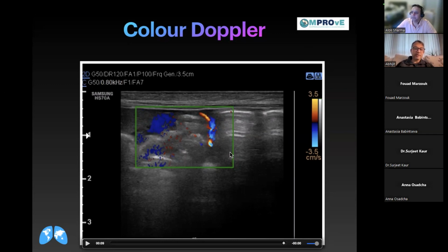The sound waves are reflecting back already from the pleural line. So in a normal lung, with the A pattern, with the A lines, you don't see the blood vessels. If your ultrasonic waves are traversing the area, which means there is no air and it's filled up with fluid, and there's an increase in vascularity, only in that case will you start seeing vessels, if any. Make sense? I hope it makes sense.